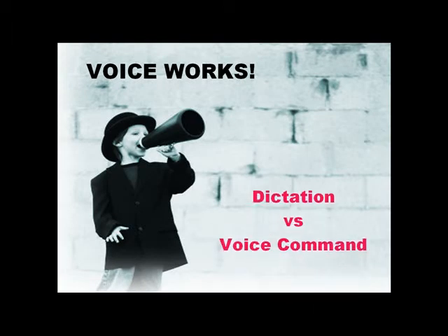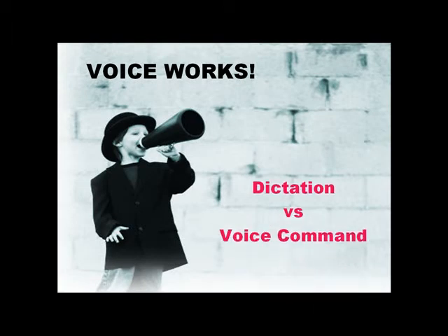Voice really works. Recent advances in voice technology promise to change the way we interact with computers in the future. Speech technology from decades past has had many limitations in a noisy clinical environment. Now voice command technology has been successfully engineered to solve the clinical challenges of traditional periodontal charting.